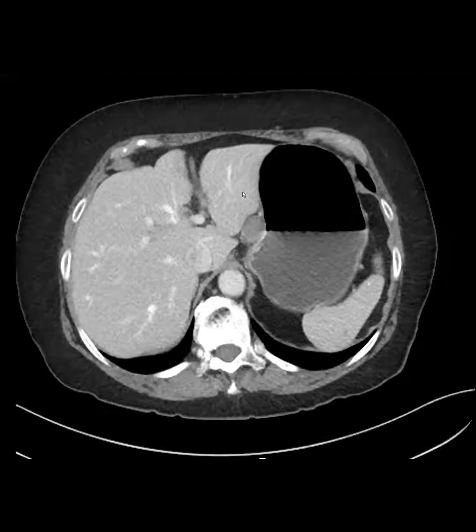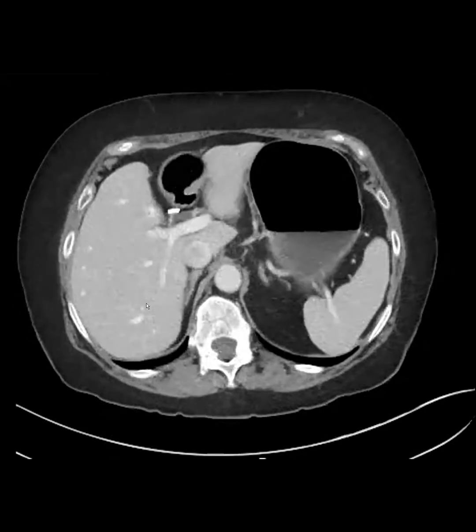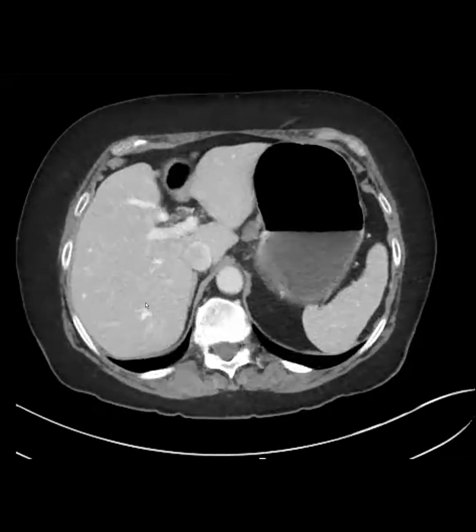One reason is because the mass can occur anywhere around the stomach, and what if the stomach is collapsed? Although we give distension, we want to see that better. At least on the first scan, we want to delineate where exactly the mass is. Is it totally endoluminal? Is it endo-extra, or totally extra? We do that with a gastric protocol, having them drink right before they get on the scanner. And some people also give fizzies to get the distension.